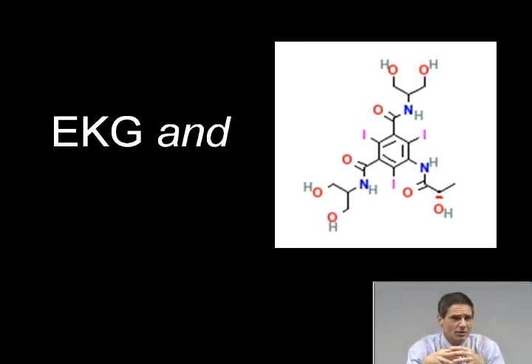This is a map of the coronary arterial tree, obtained with EKG and IV contrast. For a 64-slice scanner, your heart rate's got to be below 70, and many patients will require beta blockers to get to that rate. CT scanners with more slices and faster imaging can obtain CT angiography of the coronary arteries at higher heart rates, and we'll visit this scan in the appropriate context.